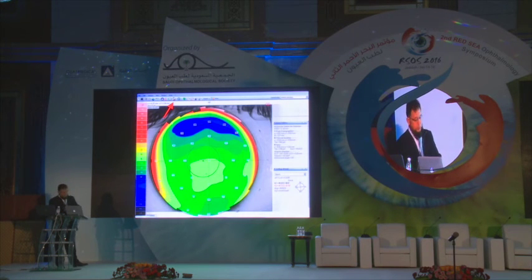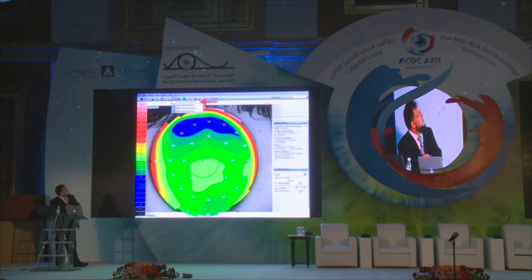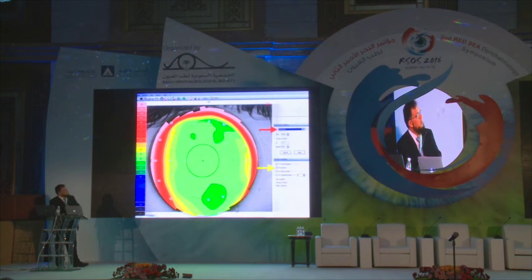We have to go to this symbol, which is called the aspherotoric symbol, and then we choose the anterior if we are going to study the anterior surface, and then we should adjust here for spherical corresponding to the best fit sphere and best DZ. In this way, this display may mimic the best fit sphere of the Pentacam.